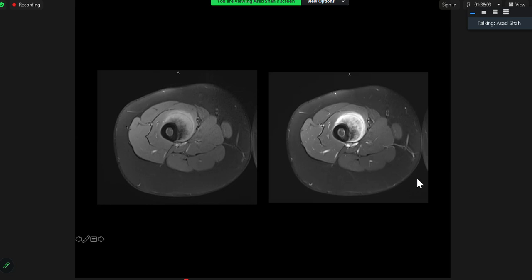Normally osteosarcoma, as you know, is more metaphyseal, isn't it? Around the knee, or any metaphysis of a long bone, you can get osteosarcoma. But this one is more diaphyseal and on the surface. This is the typical location for periosteal osteosarcoma. So don't go for inner and outer layer. We are radiologists, we're not pathologists. The periosteum is a matter of millimeters.